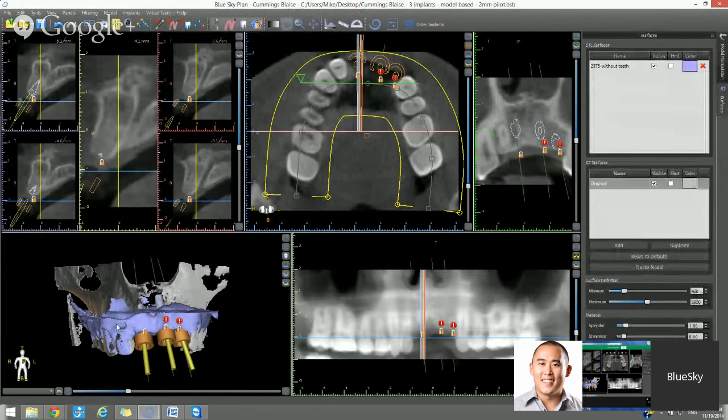First of all, as we mentioned earlier, if we double-click on the surface, it opens our surfaces panel. Here we see both the CT scan surfaces and the STL imported models. There's other functionality here as well. We're not going to be able to go into everything in detail, but you're able to cut, for example, either the model or the CT data. So if you wanted to remove parts that are unnecessary, you could do that. If you have two jaws that are open a little bit or different parts of the anatomy and you want to isolate and keep only one of them, then you can just press isolate and click on what you want to keep, and everything else will disappear. So that's some good functionality as well. You could play around with it, and if there are any questions, check out the videos, help file, or contact us with questions. But I want to get to the model import.